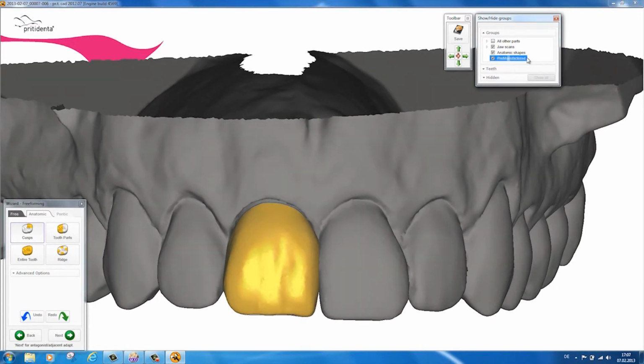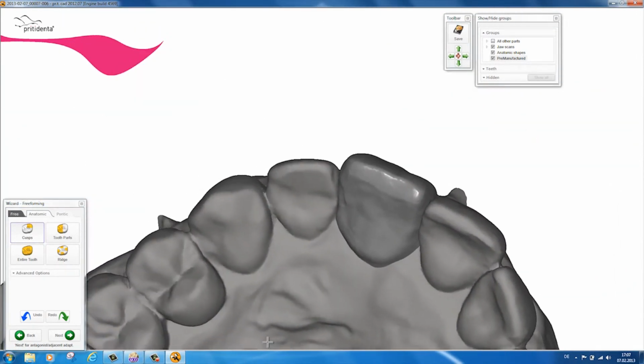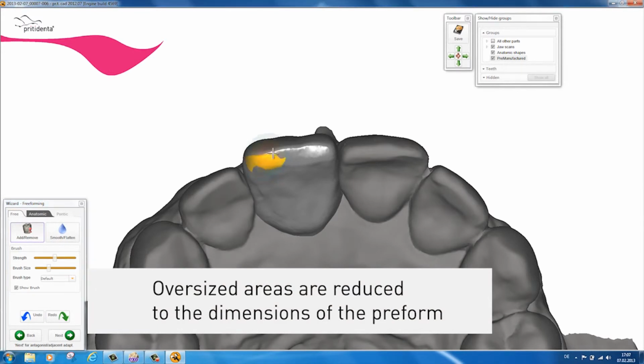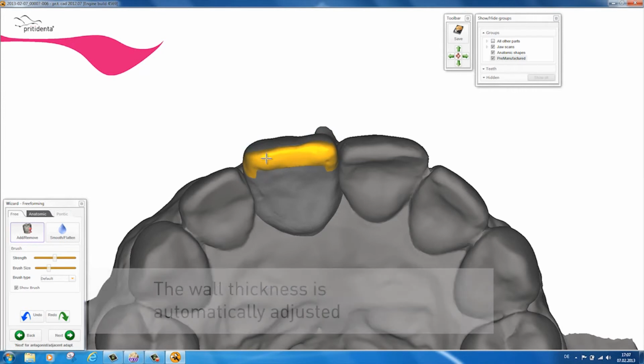Remember that yellow areas lie outside the working area of the prefab and will be calculated back down to the geometry that can be fabricated. The dimensions of any parts that are thinner than the recommended wall thicknesses will be automatically increased, provided there is room in the prefab.